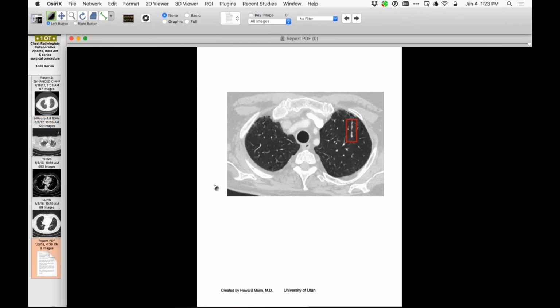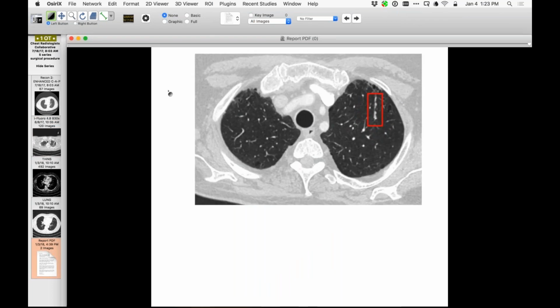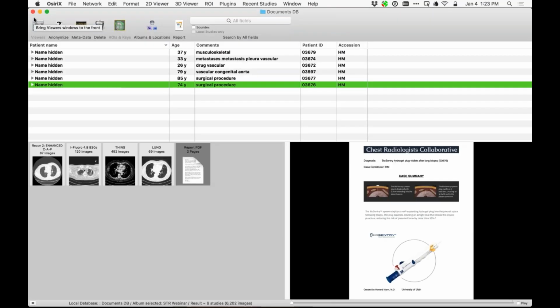Okay, he still has fingers. So that's what that stuff is. That material is really cool. I haven't seen that before. I don't know why it's so opaque. I guess it just absorbs water, and I think eventually it kind of dissolves, apparently. I'm not entirely sure about the fate of it.